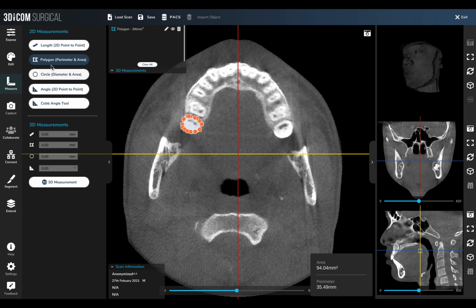Additionally, I think while you have a polygon open, it might be better to actually display the information in the top right rather than the bottom right. Again, trying to keep the information as central as possible, or put it in a side panel here and just hide everything else in the side panel that's not active at that point in time.